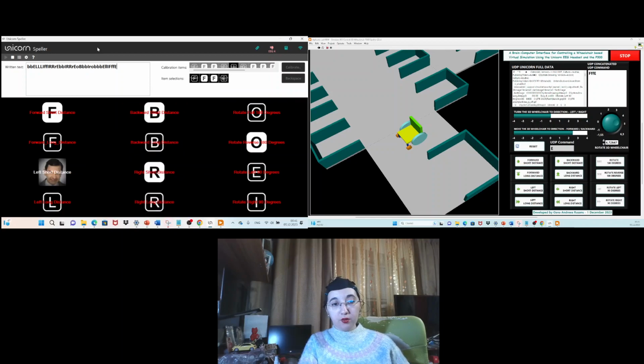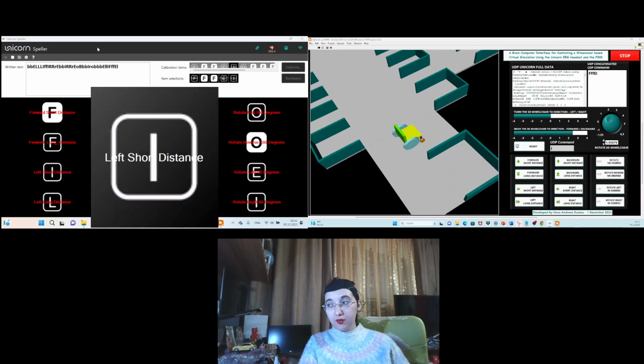It was moved. Then left short distance. Everything fine.